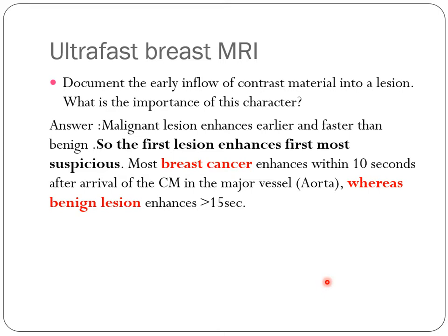So the idea is that the first lesion that enhances is the most suspicious one. Yes, this is the most suspicious lesion, and that's why the ultra-fast image can replace the delayed phase dynamic.